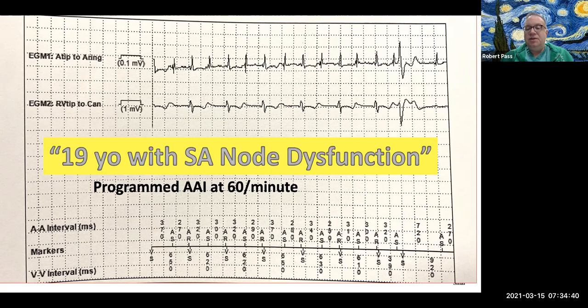It's hard to know what this is. It does look at the end as if whatever's going on here sort of abruptly ends, right? You notice there's like a pause. So I do wonder if this was an atrial arrhythmia that broke, and then, because there are no A's here, it looks like there's a PVC, and then it breaks, and maybe this is sinus. So I don't know. We don't have the rest of the strip, but it's interesting.